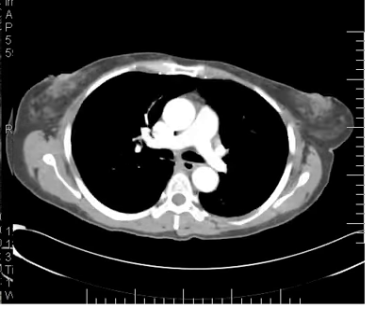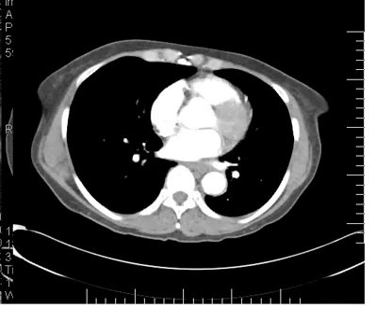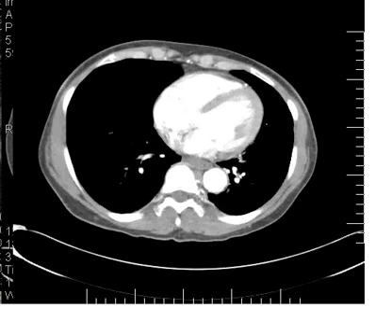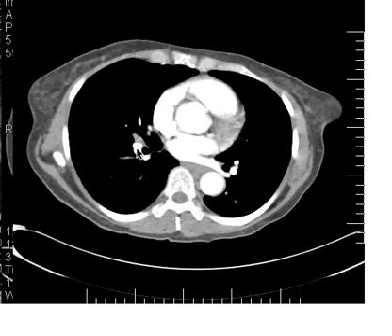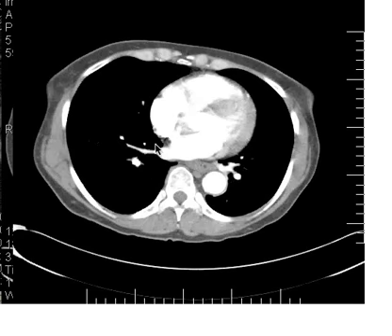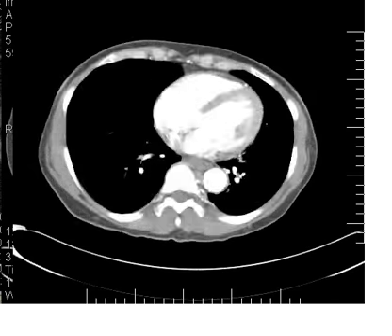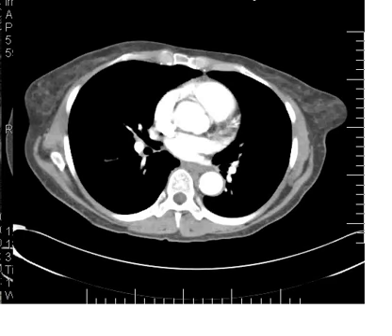And of course, in some cases, there will be very small pulmonary emboli in small branch vessels, and you will still see those generally at branch points. Now, I don't see any here, but in other words, here you see this artery starting to branch, so one could become lodged, and then you follow a pulmonary artery like this, and you see it branch, and this would be about the location that a clot would get lodged. Okay. And we'll see a little bit more in a moment.